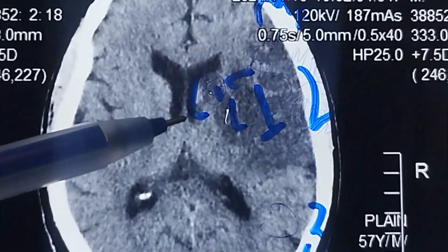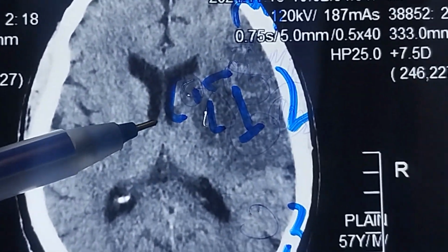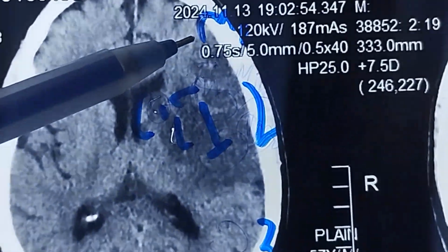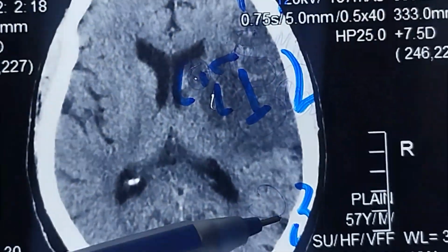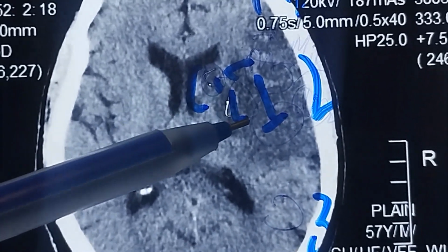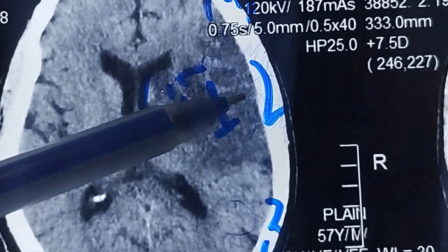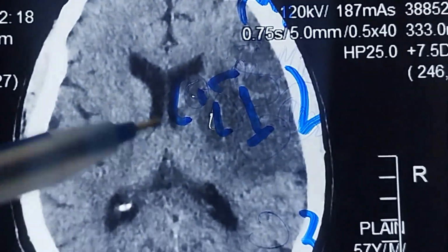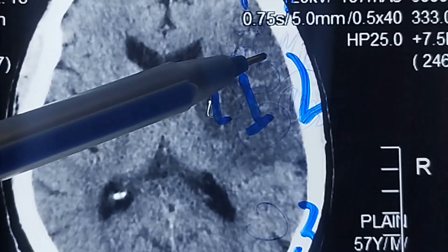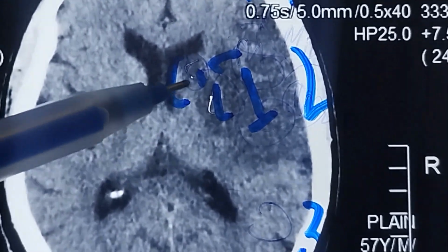Now you can see this CT brain, and this is the lateral ventricle, the CSF looks black on CT brain, but there is discontinuation, and if there is discontinuation, at that level you have to look for M1, M2 and M3. Now see the hypodensity. This area is the caudate nucleus, this is the internal capsule, this is the lentiform nucleus, this is the insular ribbon, this is M1, this area is M2 and this is M3. Now look where you see hypodensities, which are black. I see it at the M2 area. I also see it on the insular ribbon, lentiform nucleus, internal capsule and caudate nucleus.